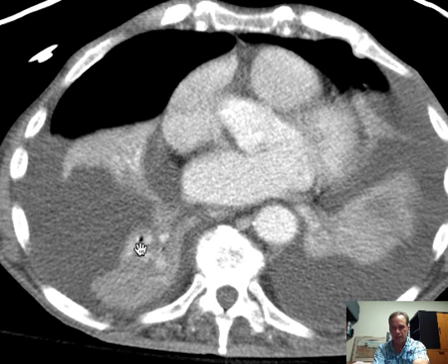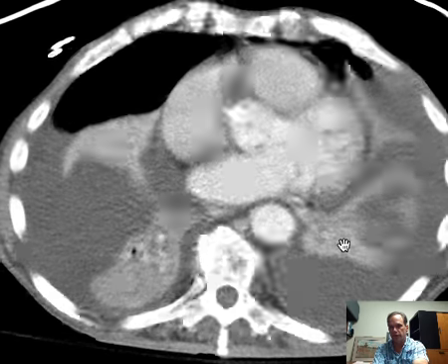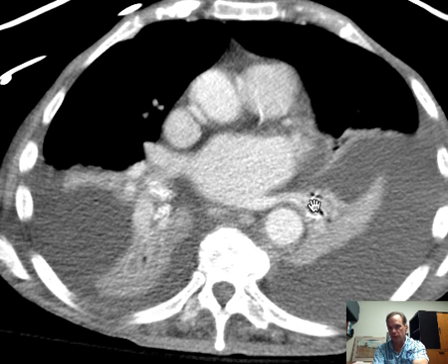Now here you can see a little tiny spot of air in one of the small bronchi there, but for the most part in here you see a little bit of air in the little bronchi, bronchioles actually, before they have branched into the finer branches more distally in that part of the lung. So these small bronchioles have enough rigidity in their wall to maintain some integrity and continue to hold air despite the surrounding pressure.